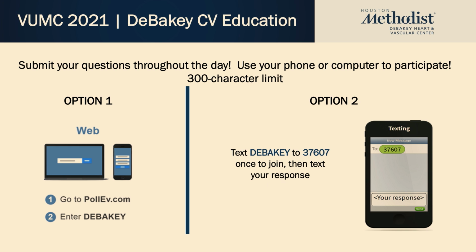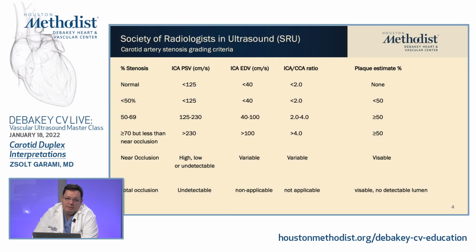I have 5 interesting cases. We are going to start with the easy one. With this easy one, we just want to show you and refresh our interpretation, which is, again, these are the velocity values, how we are interpreting our carotid ultrasound studies.